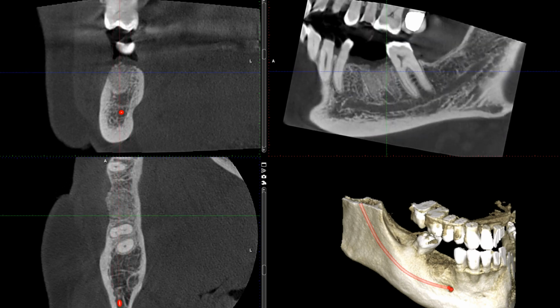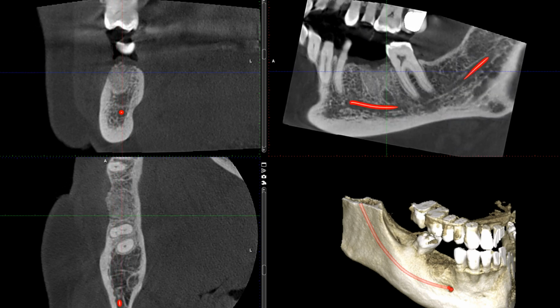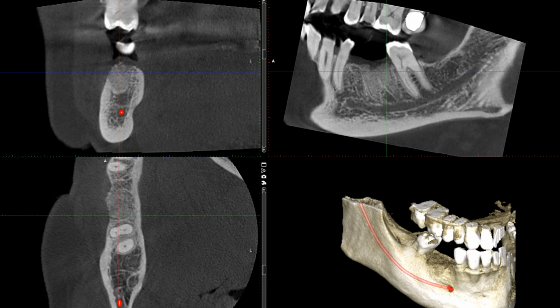So the way I would assess this procedure is healed and it's beautifully done. The graft procedure is done well, and the socket is fully healed and ready to receive a dental implant.